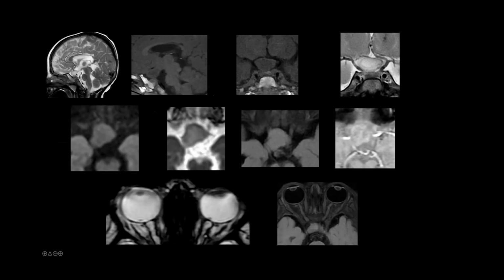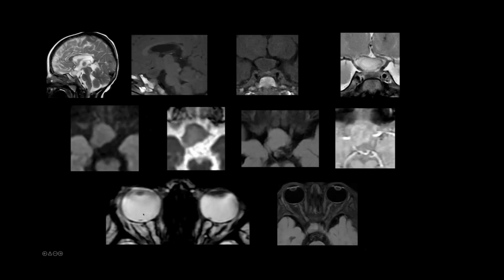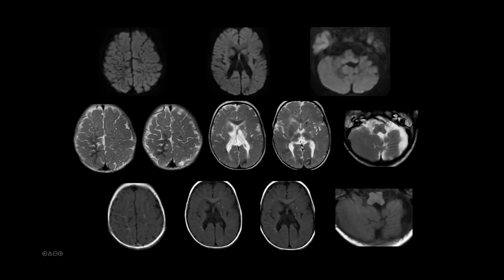If you see, the pituitary gland itself is well spared; it's only a suprasellar region along the optic pathway. So that is the hypothesis I could come to. Are there any other suggestions? Even the posterior corpus callosum is looking dysplastic. It is thinned out, along with the process of overall gliosis or chronic ischemic changes, because the white matter itself is completely abnormal.